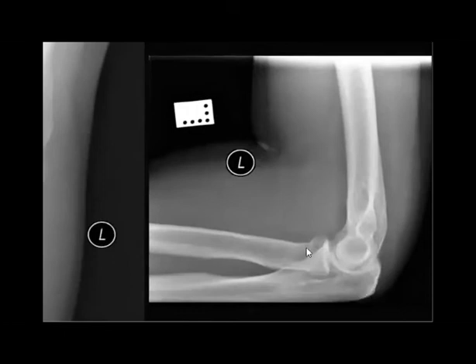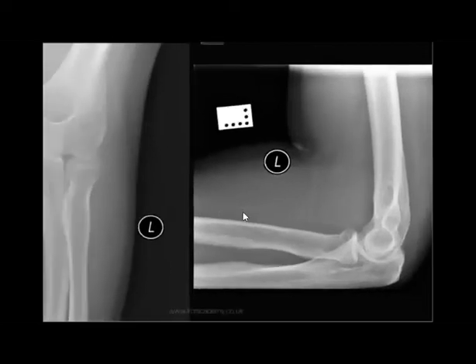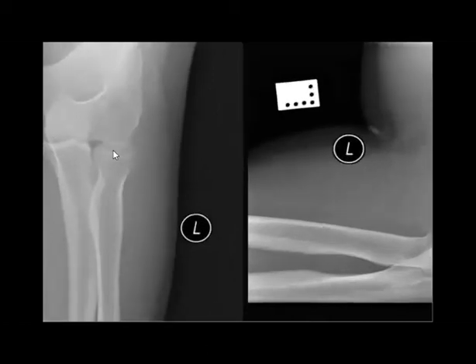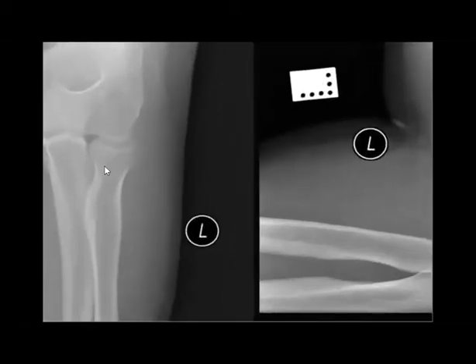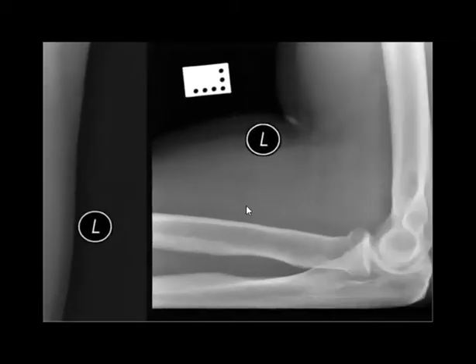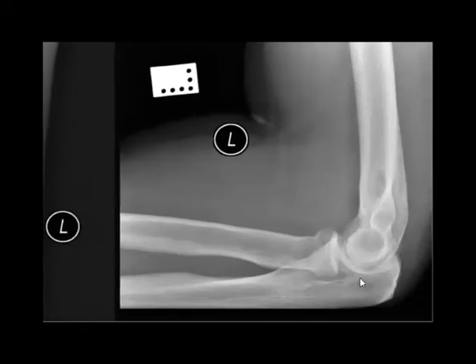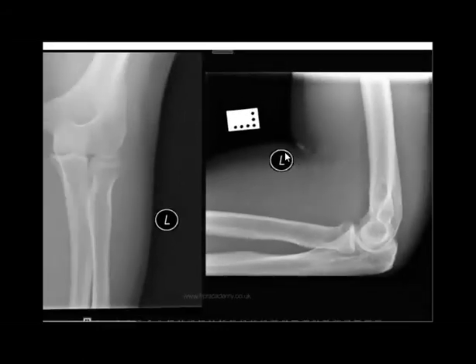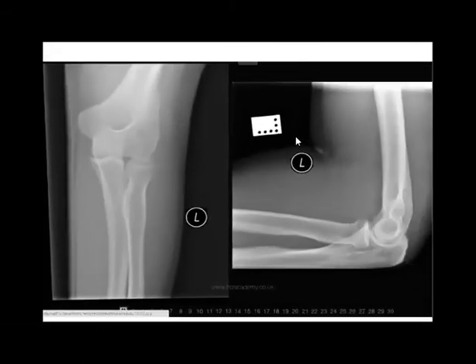Again, angulation, radial neck fracture. You can imagine here that it is very subtle. You cannot even say that it is involved. But here, in the other view, that's why you should check both views. Even in real practice, you should check both views to be sure that they are affected. Okay, perfect.